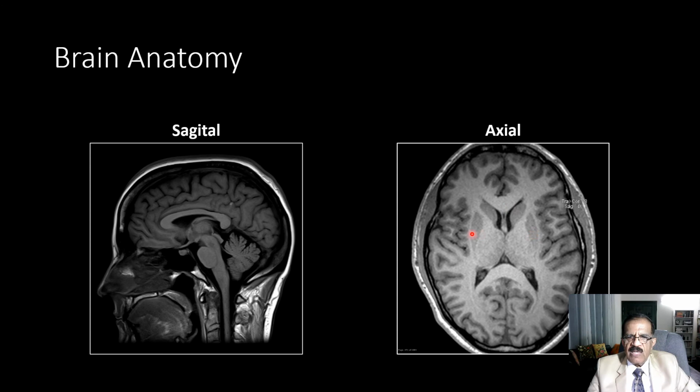This one is again, I think, the tracts, pyramids, and these are ganglia, thalami. These are the ventricles, the lateral horns of ventricles. See this one, and then this is the line which separates two sides of brain, and this is the scalp, and you cannot appreciate all the linings, but this is actually dura.